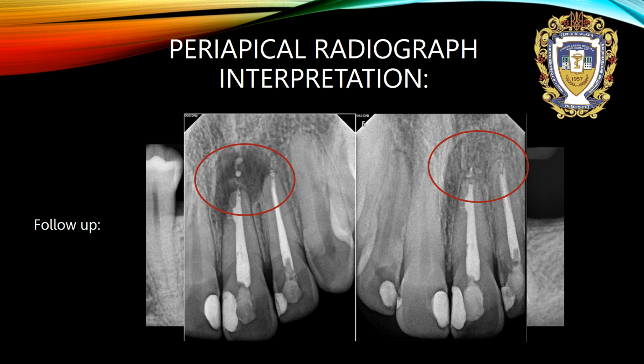As you can see, after successful endodontic treatment, we can observe restoration of bone.